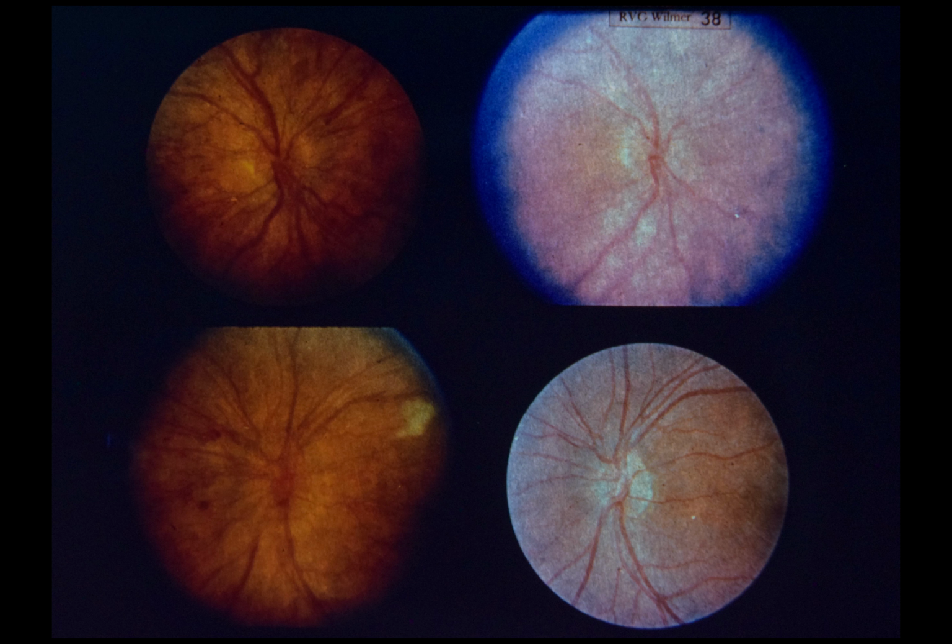Following scatter argon laser photocoagulation to the right eye, disc new vessels regressed almost completely, and the right eye has remained asymptomatic for 5 years. Upper right is appearance of right disc 5 years after treatment. Until the preliminary results of the diabetic retinopathy study were published, our practice was to photocoagulate only one eye of patients with proliferative retinopathy. Thus, the left eye in this patient received no photocoagulation treatment.